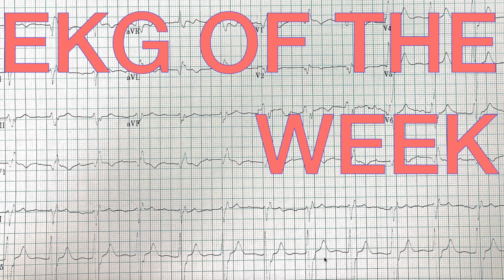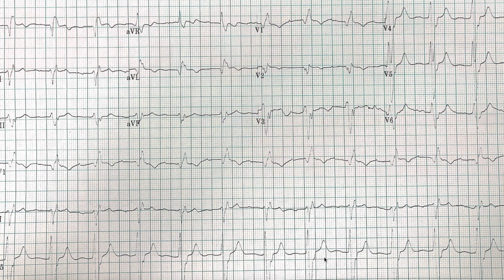EKG of the week. Let's look at another real life EKG and pick out the finer and maybe not so finer points of it. Maybe some stuff's a little more involved on this one. Let's take a peek. So we have this EKG here. Let's take a look at it, pause the video, and come back, restart it when you have an interpretation about what you think is going on with this EKG.